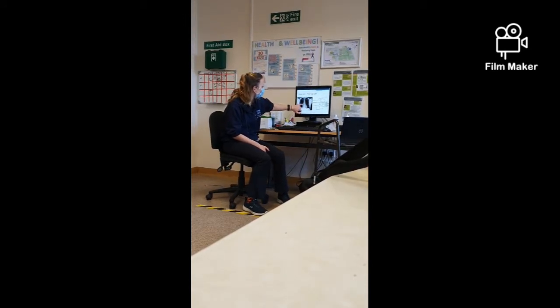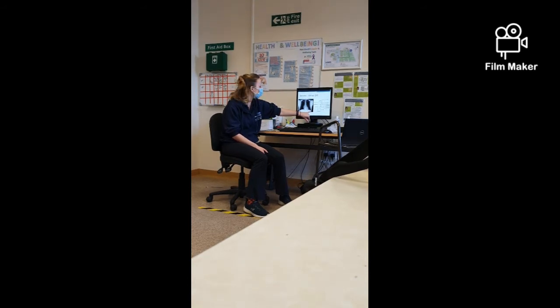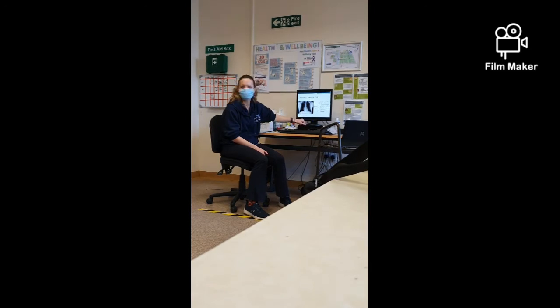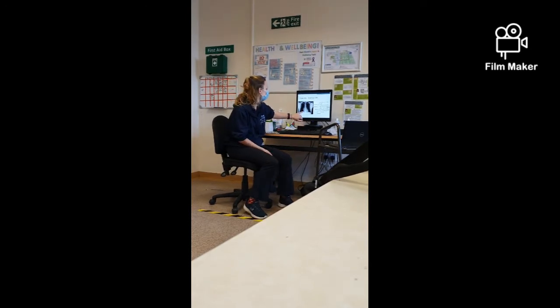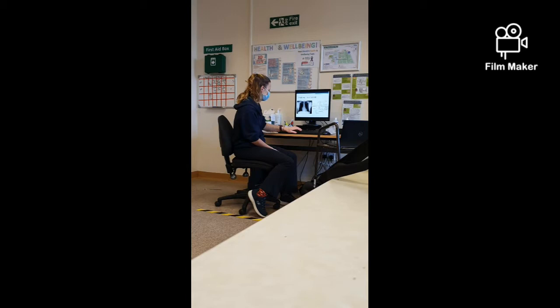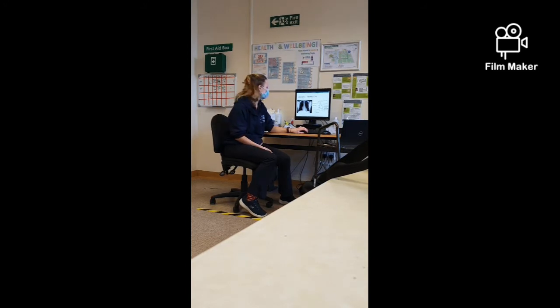And then obviously you've got your heart, your diaphragm. Does anyone know what this angle is at the bottom? Costophrenic angle, fab. And what about this angle between your diaphragm and your heart border? Cardiophrenic, excellent. And then we've obviously got the little airways which we can't see. So that is a normal chest X-ray. When you look at that, does that look normal to you? Yeah. Fabulous. The fact that we know what normal looks like helps us when we're looking for abnormal.